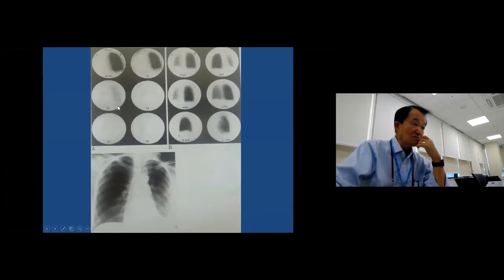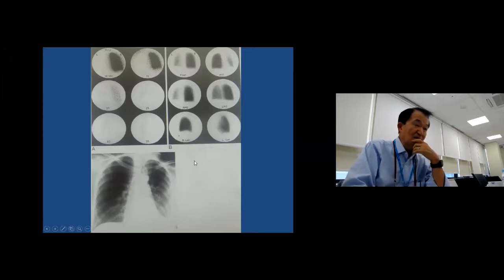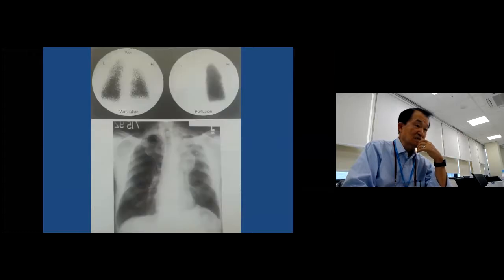So it's a lot more a ventilatory problem, and you certainly have to check for any fluid attenuation. The patient lying down and pleural effusion attenuating everything. That's the first thing you have to check with the chest X-ray. And otherwise, with this kind of large one, always think about blocking a major pulmonary bronchial segment rather than an arterial segment.